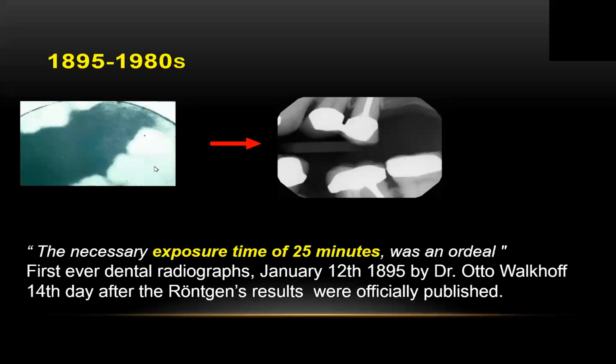So I'm sure we have patients who are concerned about radiation dose in our practice, but talk about the radiation dose here. Over the next 100 years, the quality of dental imaging improved, and all of you get images like this in your private practice with two-dimensional conventional dental radiographs, where you are able to see any kind of secondary caries or if there is an open margin on any of the restorations. But still, this was two-dimensional imaging. It is still lacking the buccolingual information.